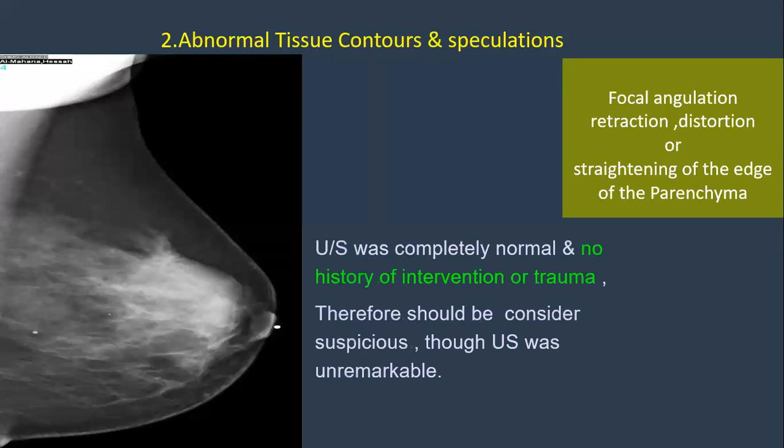Okay, a long time ago, I don't remember exactly, but this one I remember she had no ultrasound correlate, but I reported it as suspicious. And I don't remember that I could find the feedback of the result. I don't remember, long time before. And what about this one?